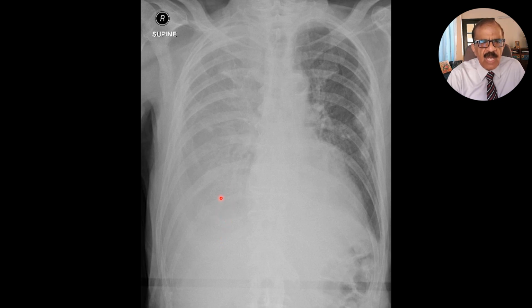So it will take the entire posterior wall, and there is lung floating in front of that. So you see pleural effusion with superimposed normal aerated lung, and this is the kind of opacity you see. This may be slightly difficult. Of course, you can consider other possibilities of large unilateral opacities, but I know this is fluid because it is supine, it has taken the entire side, you don't see the costophrenic and cardiophrenic angles, and the diaphragm is not visible. So this is a large pleural effusion, but it is an X-ray in supine position.